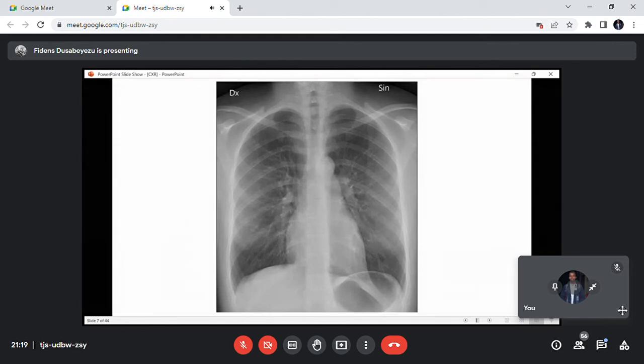Air. That's air, number 1. Number 2? Parenchyma. Alveoli. But alveoli, what do you mean? So the pocket of air.